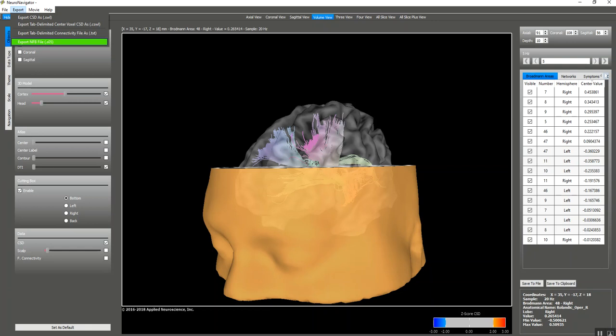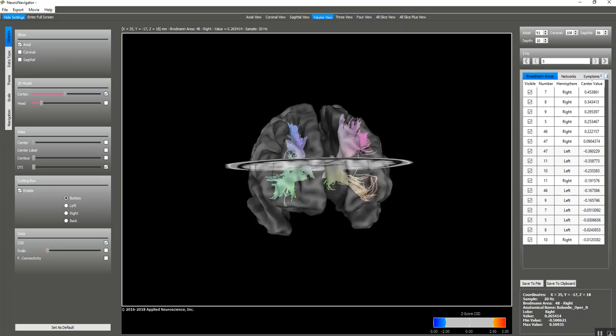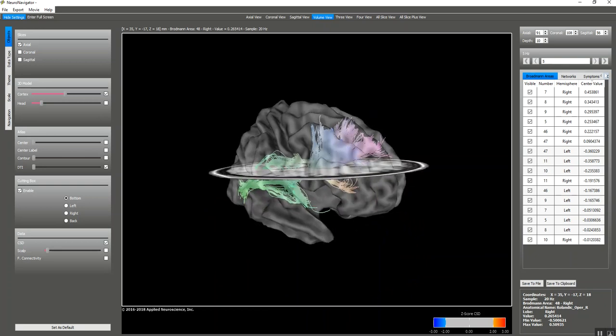It's based on what's called SW LORETA, which allows you to weight the depth of the sources and is very accurate in comparison to regular LORETA because it gives you depth with a homogeneous lead field. That's discussed in our webinars in more detail.